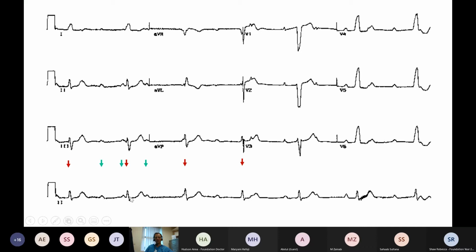Very often you can't see all of the P waves, so mark out a few and then ratchet your piece of paper along the ECG and discover that here is a P wave buried in a QRS, just where you would expect it to be. And that little hump that you weren't quite sure was something or not is clearly now a P wave.